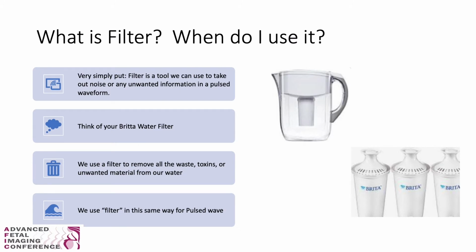So what is filter and when do I use it? Very simply put, filter is a tool we use to take out noise or any unwanted information in a pulsed waveform. I want you all to think of your Brita water filter that you have at home. We use a filter to remove all of the waste, toxins, or unwanted material from our water. We use the filter in ultrasound in a very similar fashion for pulsed wave.